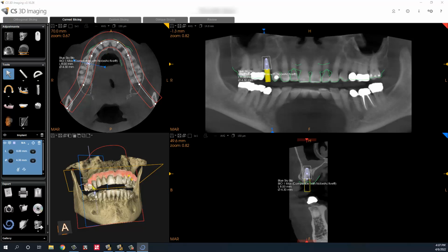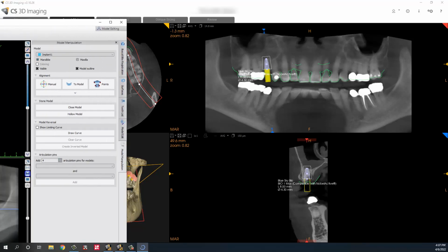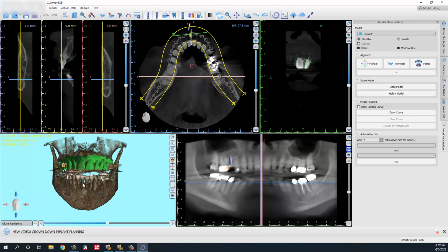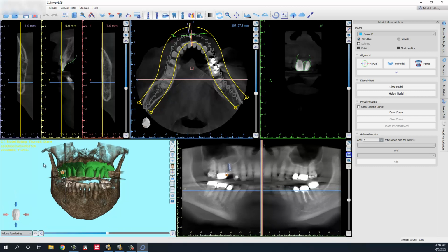All right. It's loaded, but it's loading, I should say. Okay, so I'm just going to drag this over here, and there we go. So here, it's all loaded. I've got to get rid of all these. Give me a second. Okay, so now we can see this all.